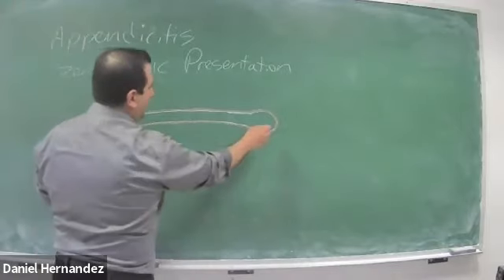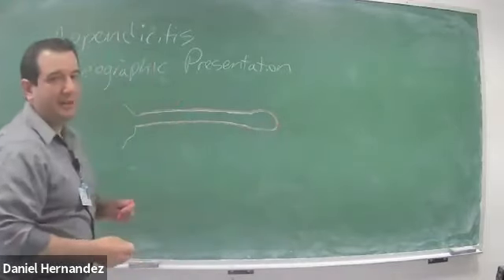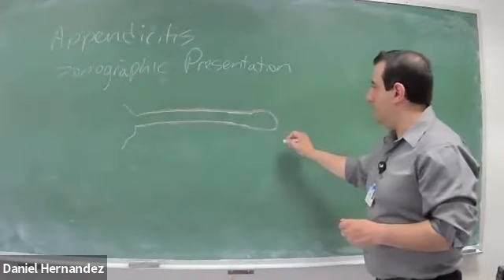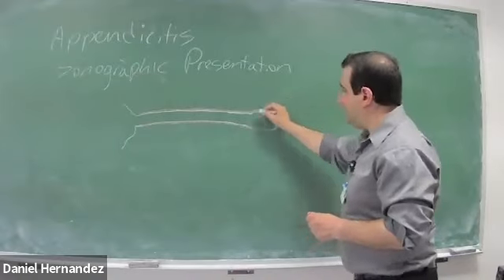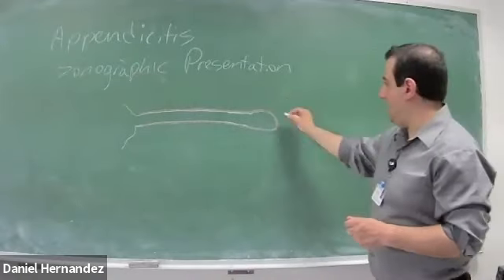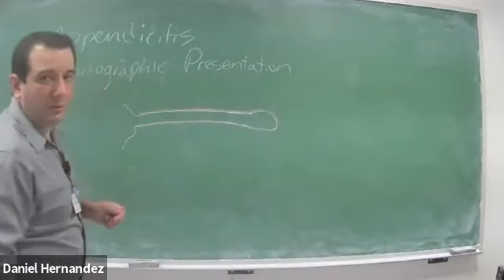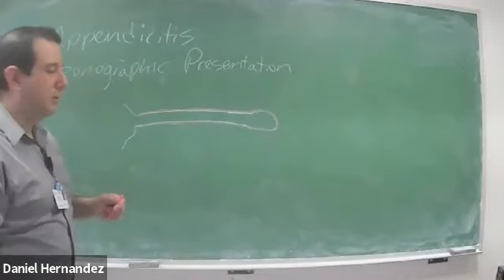The majority of appendicitis will begin in the tip, so you may have just early tip appendicitis. This segment may measure 7 or 8 millimeters, whereas the more proximal segment could be 4 or 5 millimeters, within your normal range.